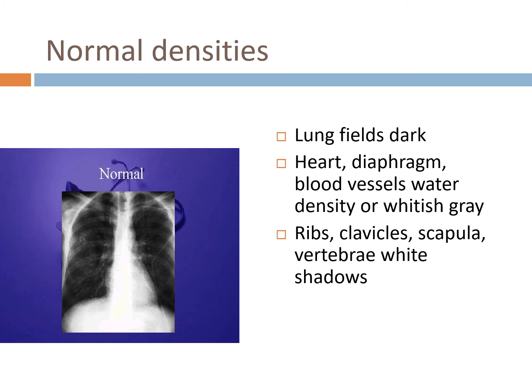Remember that lung consolidation due to pneumonia, tumors, or collapsed area is going to absorb more of the X-ray, and it's going to appear white and patchy on the film. Cavities or blebs are going to absorb fewer X-rays, so those are going to appear darker.